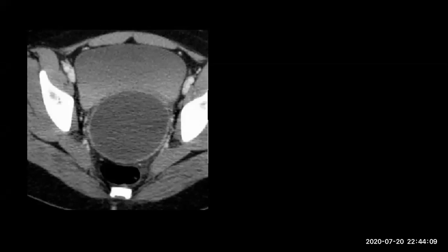Okay. Other differential. Dermoid, epidermoid, lymphangioma. Meningocele. Any other? Meningocele should be posterior, posterior to the rectum. Okay. So what is your question you want to ask to reach the diagnosis?